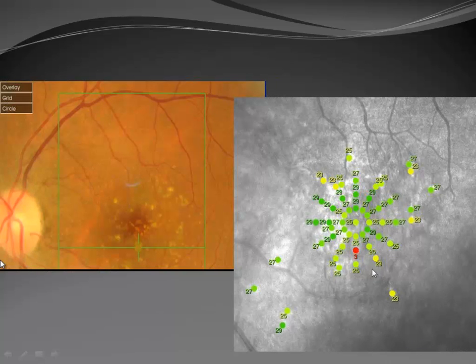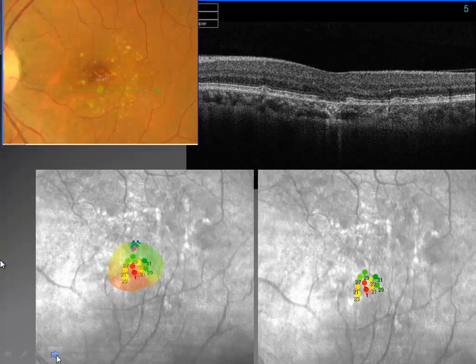and then test the areas. So here's one of the standard visual fields we do with this instrument. And notice, green is normal sensitivity. It's usually about 28 to 32 decibels. Yellow is slightly reduced sensitivity, as you can see, in the 20s. But there's one point that's dramatically reduced over here in red. That point corresponds to this point here. So that point doesn't see. That's very reduced sensitivity at that point.